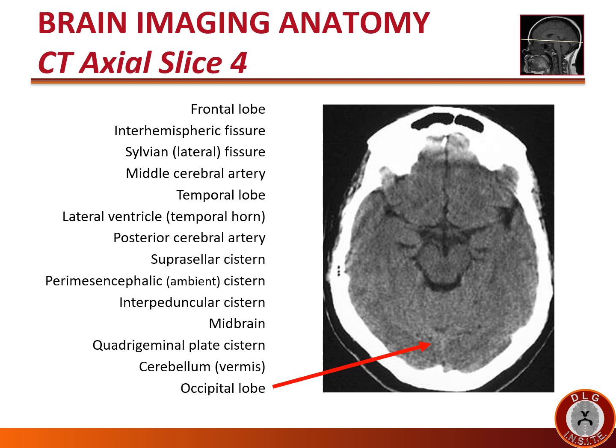Cerebellum, more rostrally, is peaked like a tent, and so you see the cerebellum vermis right behind the quadrigeminal plate cistern, but behind the cerebellum, you'll notice that there is a linear whiteness or hyperdense area right behind it that is dura. And so because you have this dural structure in between the two sides, you now have the occipital lobe. The occipital lobe is separated into two sides with a dura in between or fissure in between.